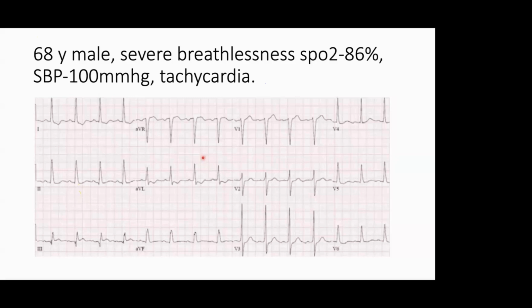I will show the more prominent ECG. This is a subtle ECG. This also you shouldn't miss. That's why I'm showing it first. AVR ST elevation with diffuse ST depression indicates global left ventricular ischemia. It will come from occlusion of the left main coronary artery.